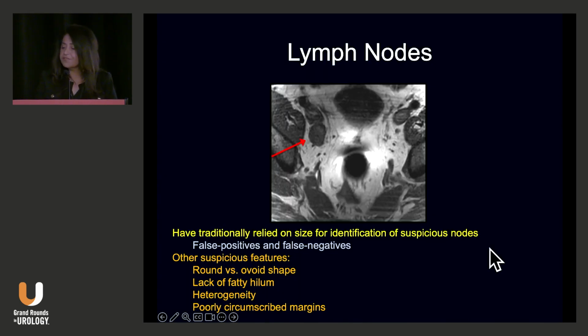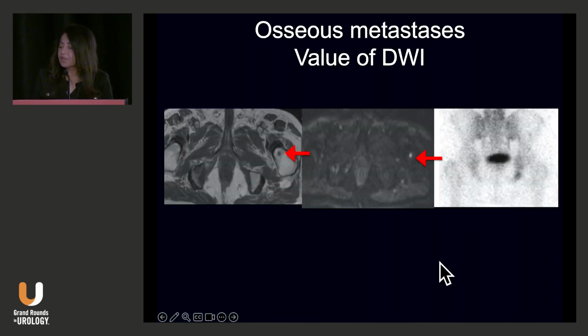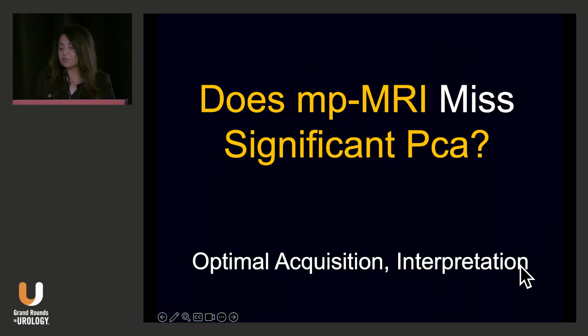We can also see lymph nodes, bony areas that are better seen on MRI, et cetera. And then this was not seen on typical nuclear medicine scan that you can see. But of course, now with PSMA PET, that's a totally different thing. Now, but what about bladder? We can also see bladder lesions. So we see a lot of extraprostatic rectal, bladder, et cetera.